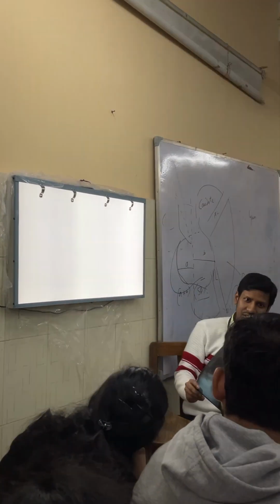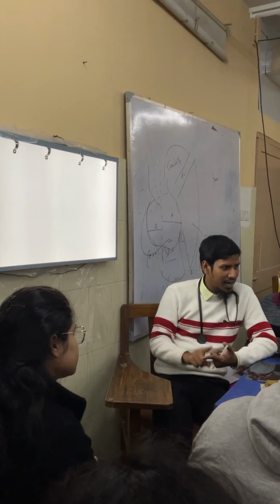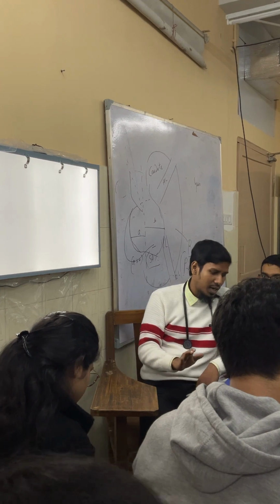So within the lung fields we will see the bronchi, vascular markings and parenchymal markings. So bronchovascular markings and lung parenchyma.